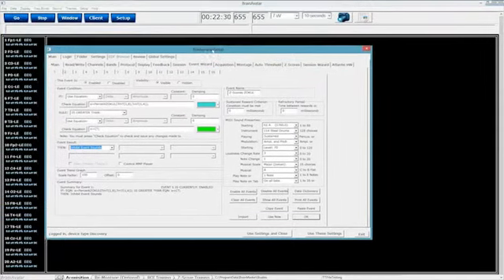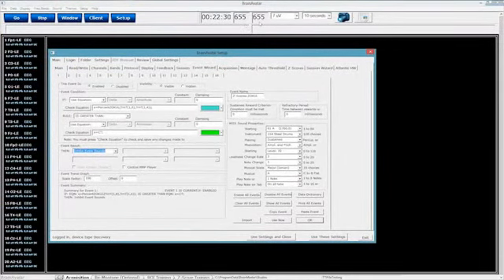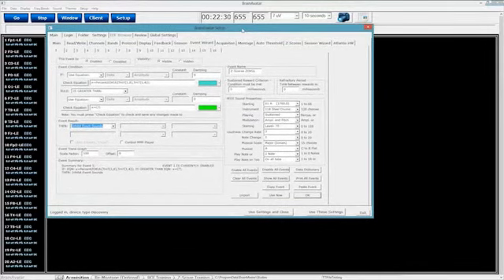Most of you might not know this, but we actually do have 2 point counters in the software. It was built in for couples training, and it has other purposes that have been used out there. One, for example, is for our BrainTrack that was on a show on the BBC for a while, which allowed neurofeedback training to control little cars. So that's built in for that, as well as these activate relays. Most of you, unless you own a BrainTrack, will never use activate relay 1 or 2.